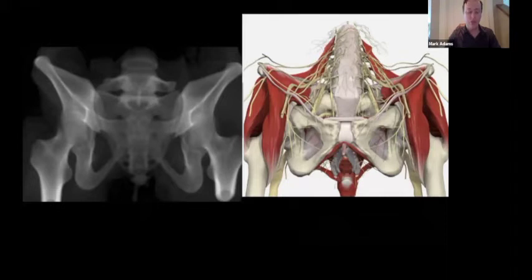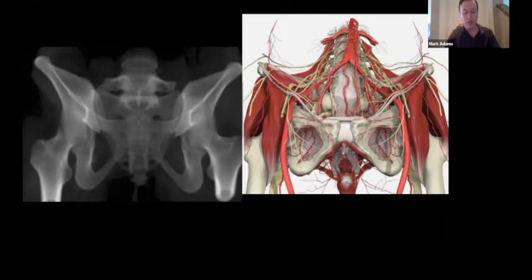The S1 nerve root is also visible, coursing out laterally from its foramen. The internal iliac and its branches are also in close proximity to the lateral sacral ala, and the median sacral artery is adjacent to the sacral bodies in the midline. More anteriorly, the external iliac courses over the anterior pelvic ring, just medial to that iliopectineal eminence.